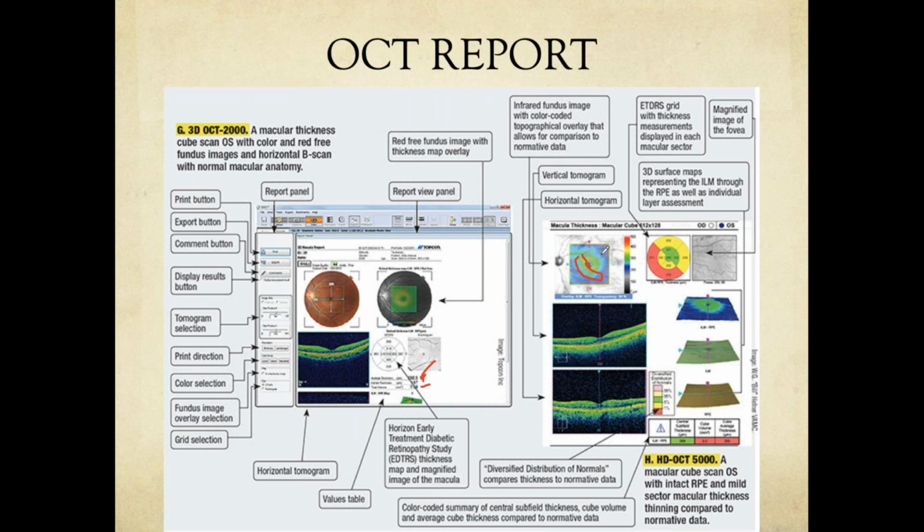So what you have to do is take a look at the retina scan. This is the topography, right? So you don't see any areas corresponding to red areas over here, but most likely there's some edema or swelling that could possibly be over here.